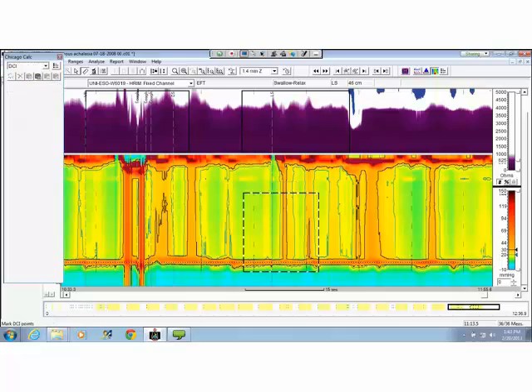The 30 millimeter. No, I'm going to include everything within the 20 millimeter isobaric contour. Sorry if I misspoke. I meant the blue line there. I want to include everything inside that blue line. I don't want to make it too small because now I'm not including everything inside the blue line. I'm going to pull it out here so I get all of this data inside the box.